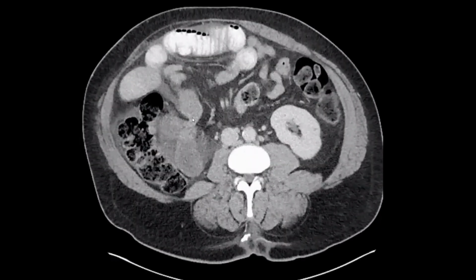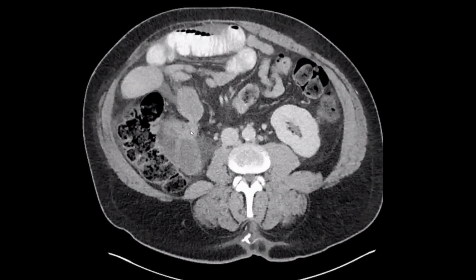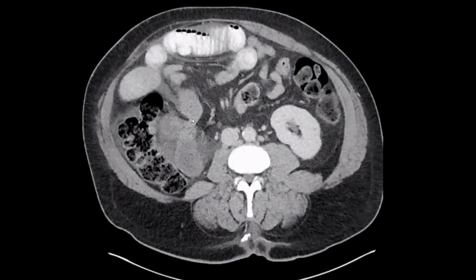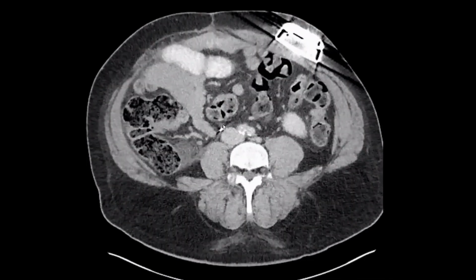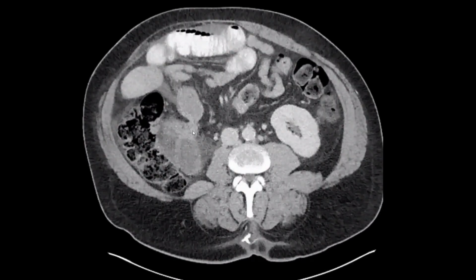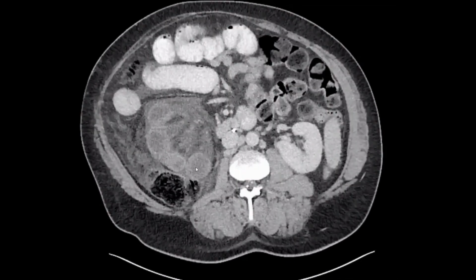We have here a transition point. Look for these dilated bowel loops upstream. Dilated bowel loops, and this one is going here, kinking of the bowel towards these dilated bowel loops. So we have here the first transition point, and also the second transition point here to the collapsed bowel loops distally. So we have two transition points very close to each other, and we have dilated bowel loops in a radial configuration or C-shaped configuration.